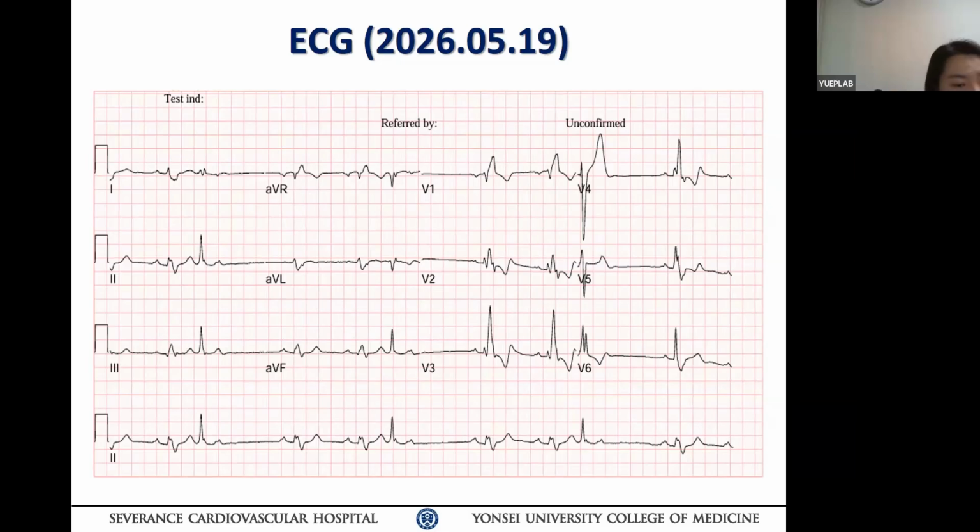But this patient has a fixed, permanent right bundle branch block, which commonly happens after congenital heart surgery. Surgical techniques will sometimes knock out the right bundle completely. On top of that, right ventricular overload can cause that too. So what do you think, Dr.? Yeah, I think so, I agree. Dr. sees more congenital disease than you guys.